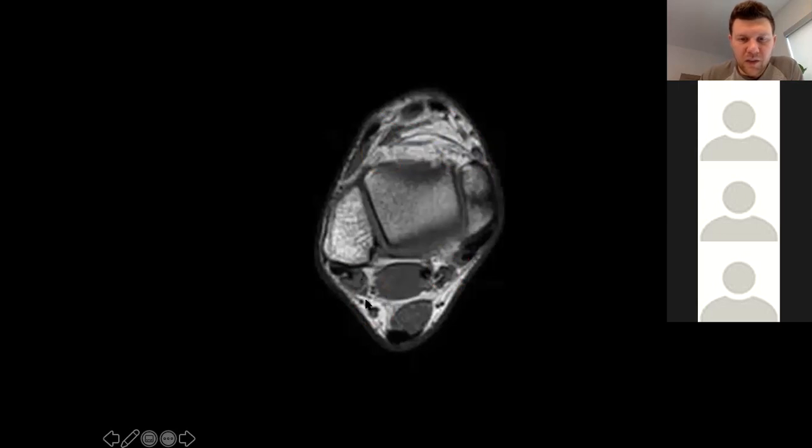And can you see this really thin black line that originates right here? Yeah. What would be a thin black line that's going to go right over top of those muscles? So the retinaculum. Good. Okay. What muscle is this down here? That would be, no, still same deep posterior compartment.